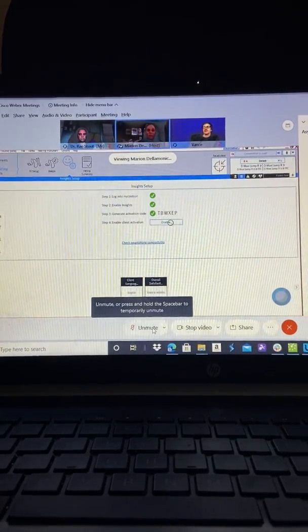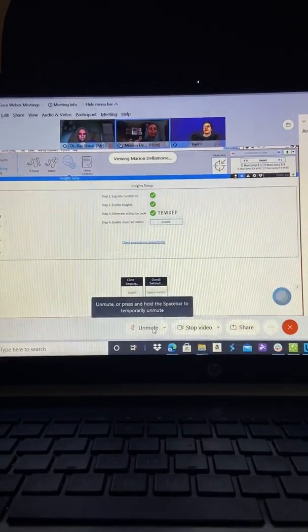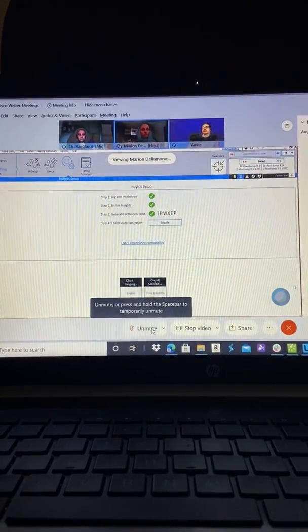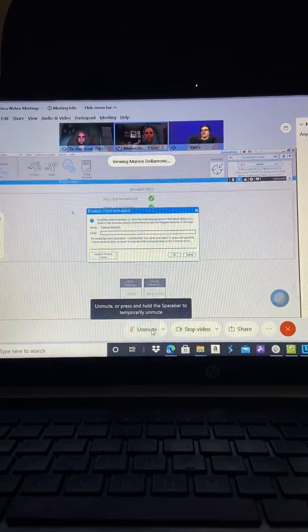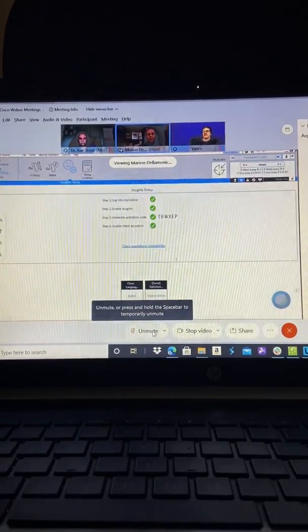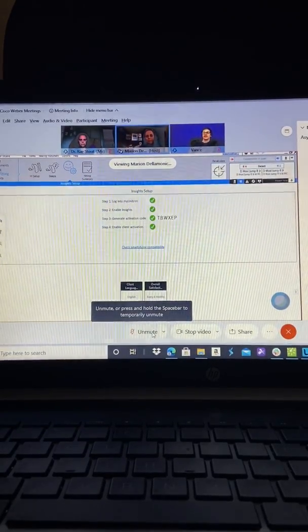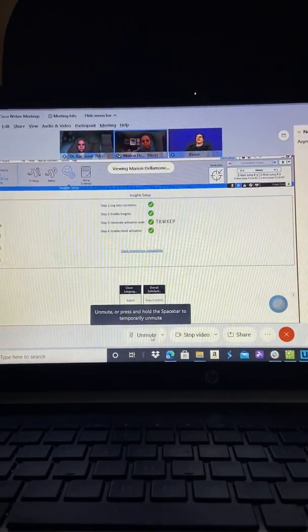It's that same enable button. I know there's a code listed. That code automatically goes to the hearing aid. So it's very rare that you need to actually use that code for anything. But you just click enable, ignore that email, just click OK right here, and you've activated on your end. So it's really just one click in software, honestly. That's what you have to do in software.